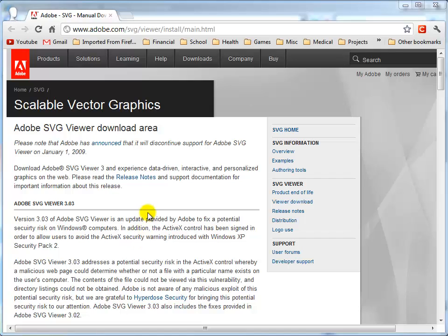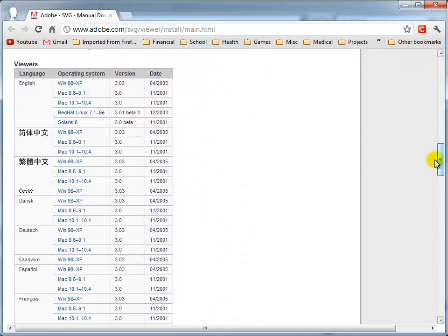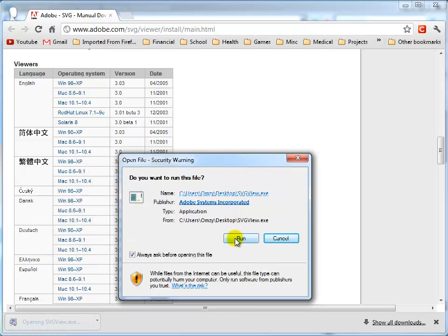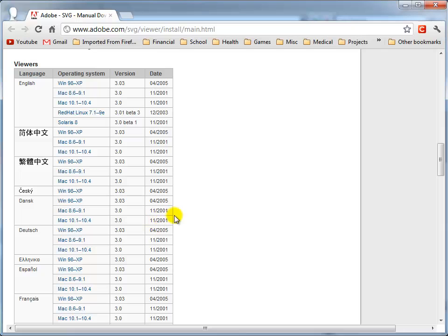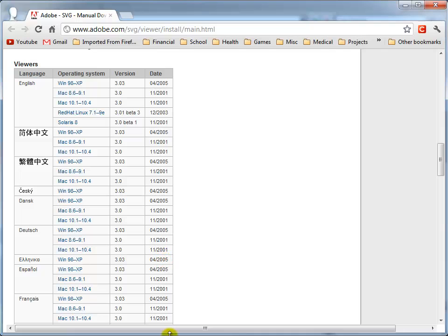Visit Adobe's website, which we have open here, to download the appropriate viewer. You can find the link to this website on the MIRC at KUMC website in the tutorial on annotating images. Just scroll down and find the appropriate version for your machine. Allow it to download and then open it. And the install has succeeded. Once this is done, you're ready to start annotating.